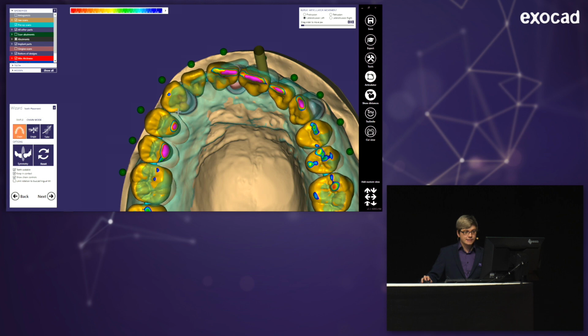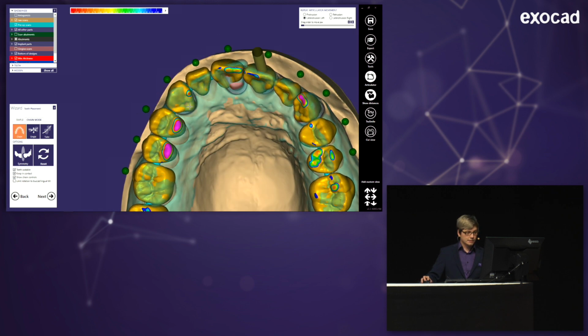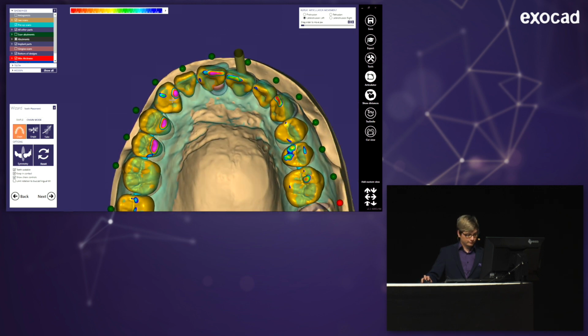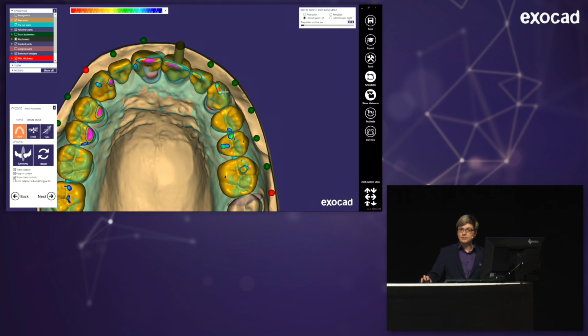And you see it starts getting visibly a bit harder to move it around. But still, I'm placing the canine, scaling it a little bit, and lock this as well. And now the last canine, you might see, really fights back when I try to move it, because it's a really short area I try to move.